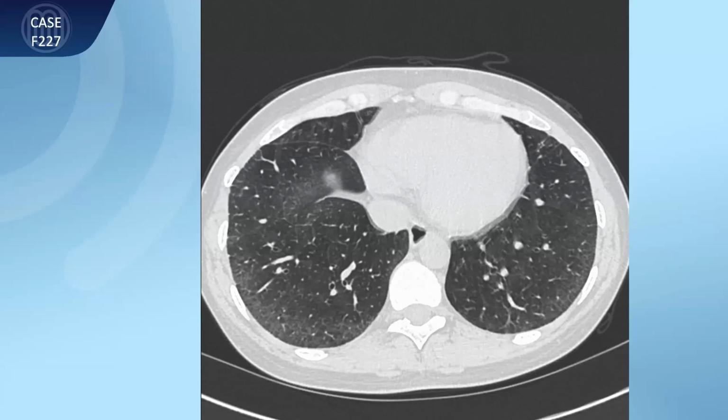Lymphadenopathy in ILD is quite commonly seen. So if you see a lymphadenopathy, don't worry too much about differential diagnosis unless you see a very prominent lymphadenopathy. If you see a prominent lymphadenopathy, you should also consider sarcoidosis. Sarcoidosis is an important differential diagnosis for these diseases, but in this case I would not be concerned too much about it, as you may also see lymphadenopathy in NSIP. There's one caveat. In patients with Sjögren's syndrome, you know that there's an association with lymphoma. So if we see a very prominent lymphadenopathy in patients with Sjögren's, I would be concerned that this could be a malignancy, and we go from there and biopsy that.